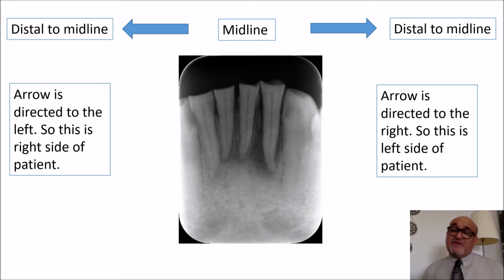How about the central incisors? In the central incisors, imagine yourself looking at a panoramic radiograph. If you don't like to follow this line, these steps, imagine that you're looking at an OPG.